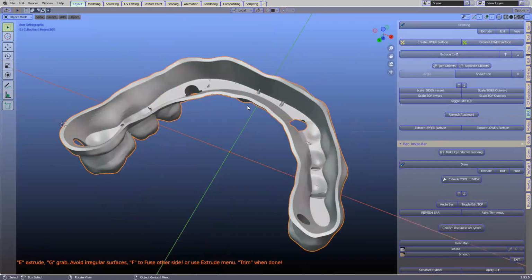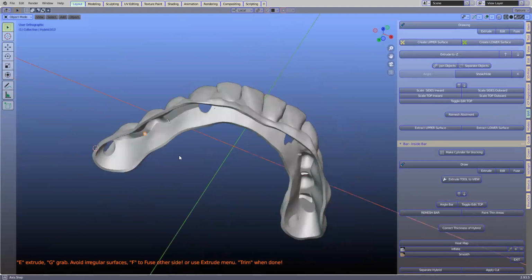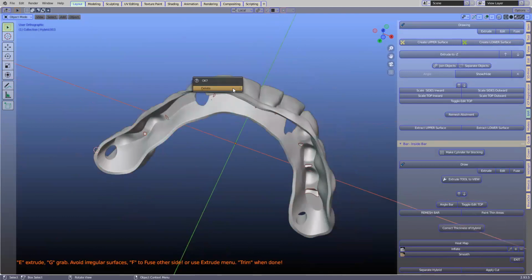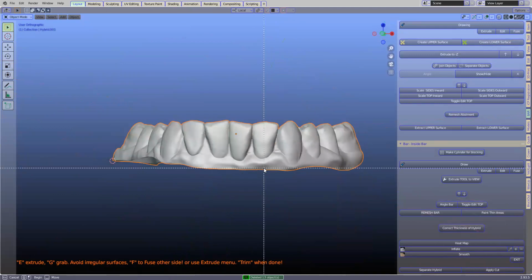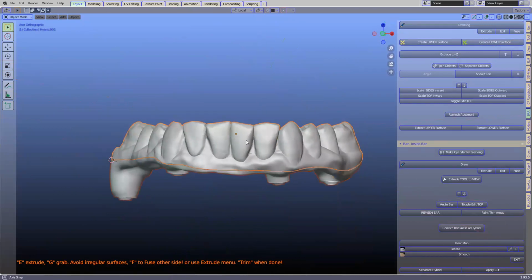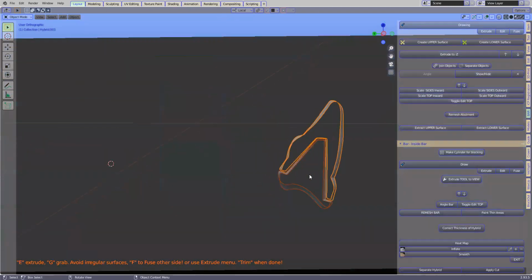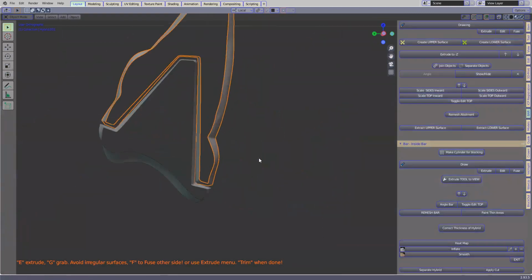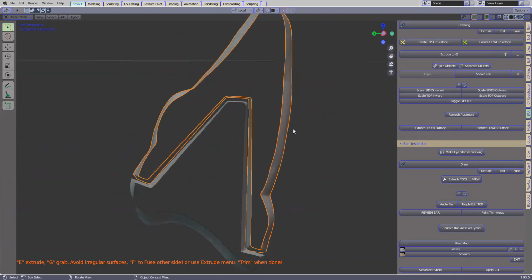And that's our structure. We've got a few bits and pieces hanging here. I don't know why. That's another thing I've got to look into. Doesn't matter. You can just Control I, X, and delete these. Other than that, awesome. Let us have a quick look in cross section at what that actually looks like. Alt B. Here we go. So we've got one and the other, and the cement space which runs through the middle.